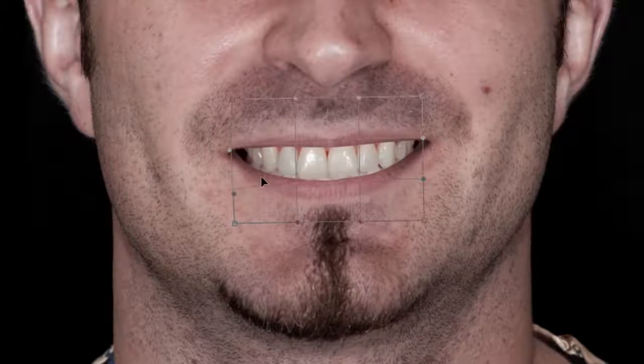And so in other words, what I'm doing, I'm just custom forming visually what I think is going to look good in his particular face right there. All right, and that is maybe a smile line that's a little bit better for him, okay? And then I can also use that other tool, Liquify, if you remember you learned in an earlier chapter, to slightly customize, okay? So I'm going to maybe flatten the plane of occlusion right here just a little bit. All right, I can come back here.